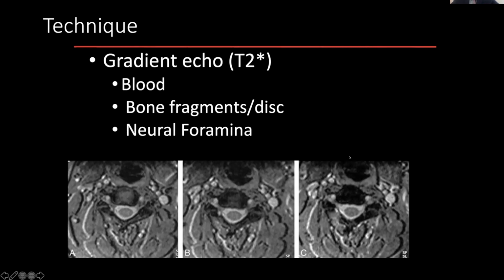My bad. So the low signal, which is what we call signal dropout, occurs when you have a substance which forms its own magnetic field around itself, and gets exacerbated by this type of sequence. It's kind of one of those things where, is it a feature or is it a bug? It's a bug when you're trying to see details adjacent to, for example, metalware, and metalware is causing susceptibility artifact. But it's a feature when you can use that tendency of these kinds of materials to show you blood products better.